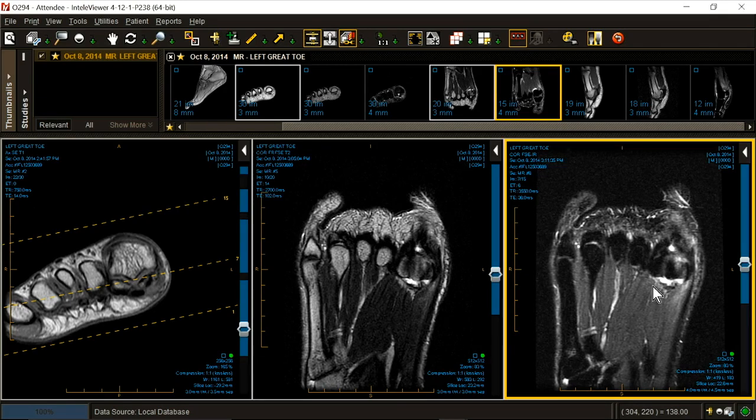So he's got a strain of the FHB medial head. It's a complex case. It's no coincidence that he's got a strain of the FHB medial head on the side where we have the remodeled sclerotic sesamoid and the remodeled dysplastic crista groove. This is turf toe. Non-surgical turf toe.